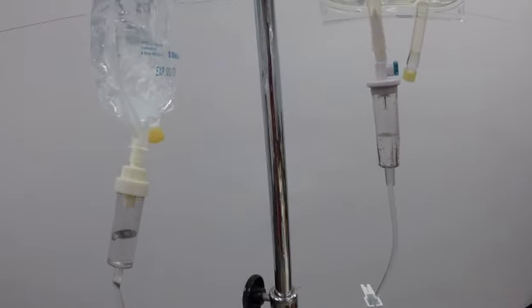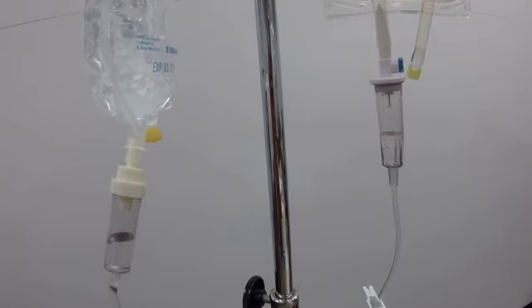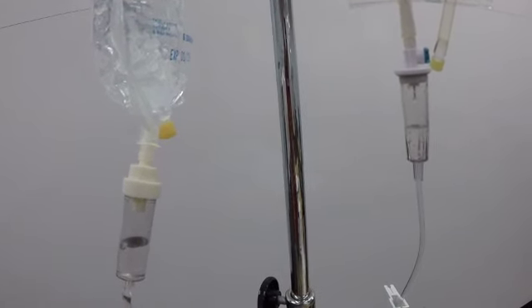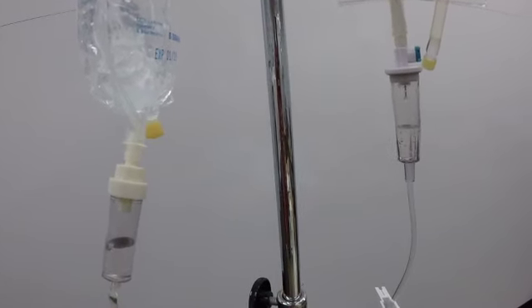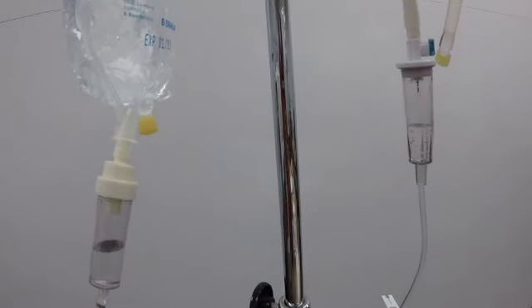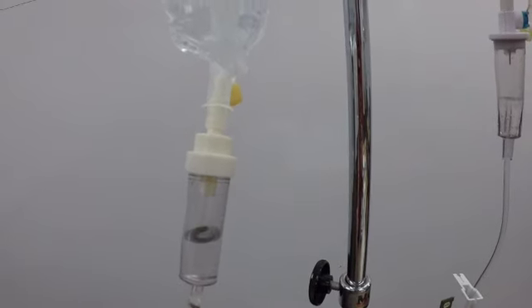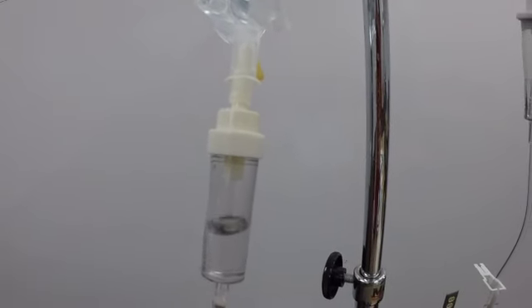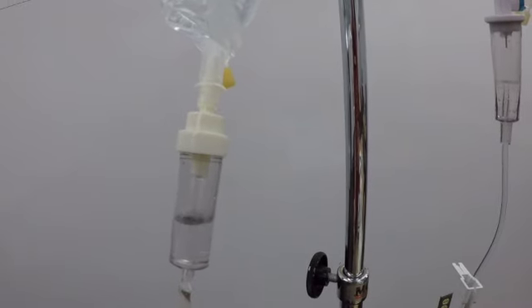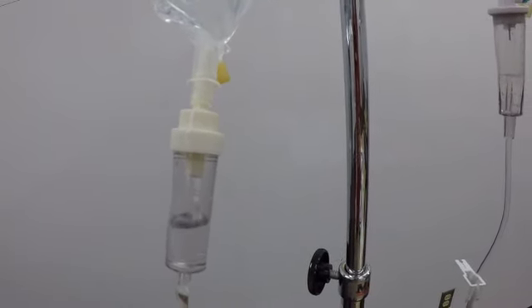Okay, so just look at the difference between the flow rates. On the left is a macro drip set. Honestly, I don't know what it is. I think it's 10. I think it's the packaging that was in 10, but we've been using it for training, and it came out of the package, so I can't be sure. But I do know it's a macro drip set because there's no needle. And so we're just going to open this up. So we have a patient who's, we'll say they're dehydrated and they need a lot of fluid. We're going to try to give them a liter of fluid.